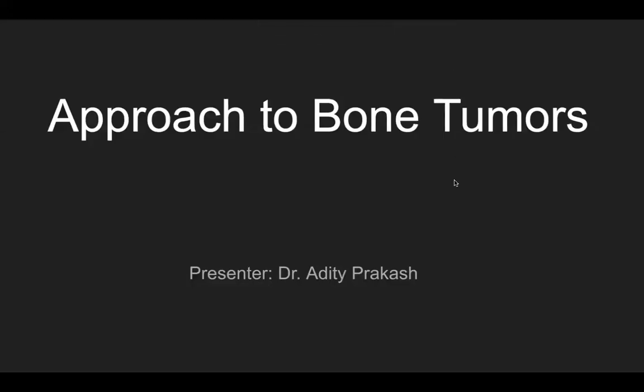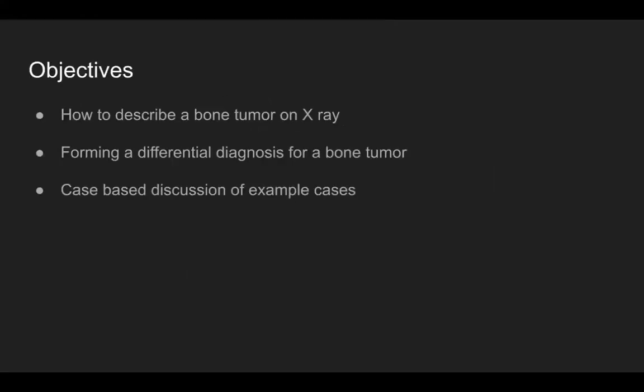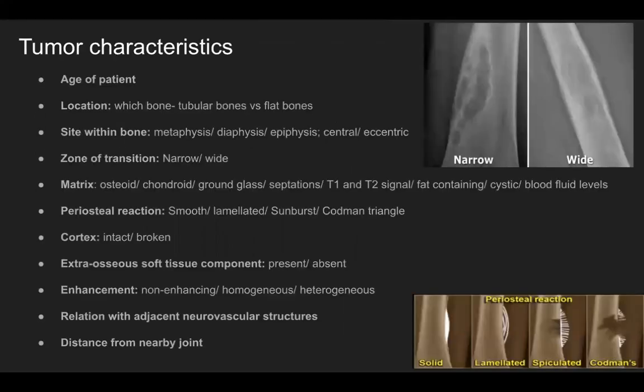Good morning, everyone. Today I'm going to present on the topic approach to bone tumors in radiology. So today we'll learn how to describe a bone tumor on an X-ray. We learn how to form a differential diagnosis for a given bone tumor, and then we'll also discuss some example cases. So first of all, how to describe a bone tumor.